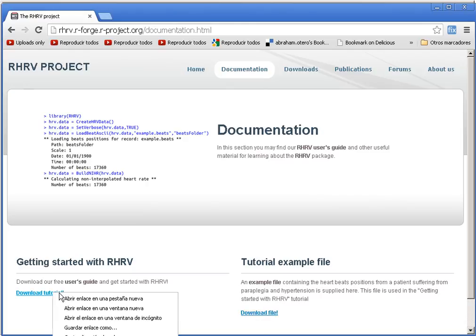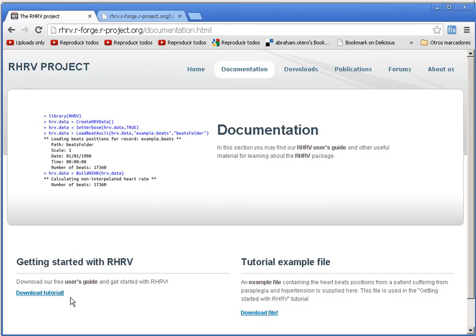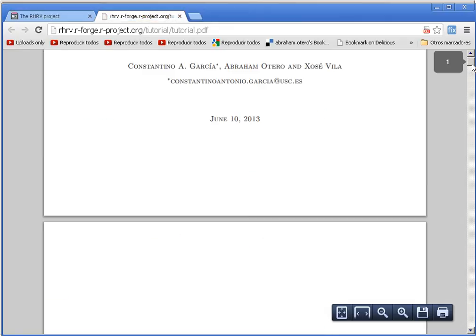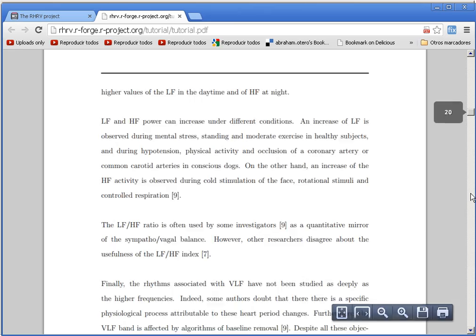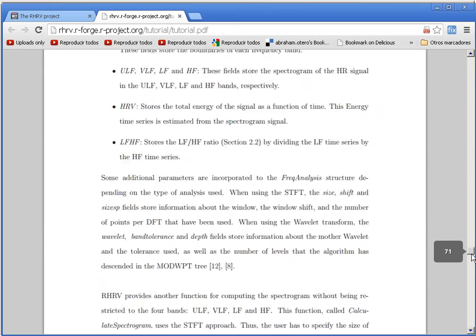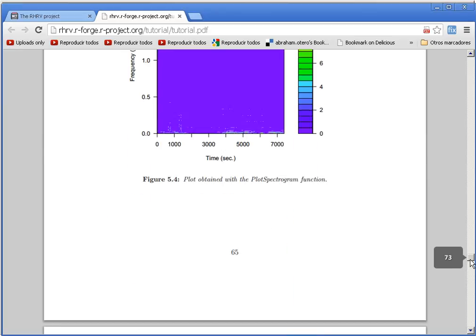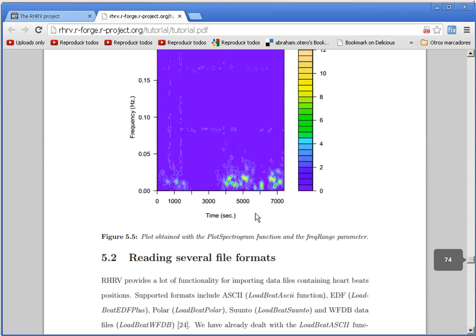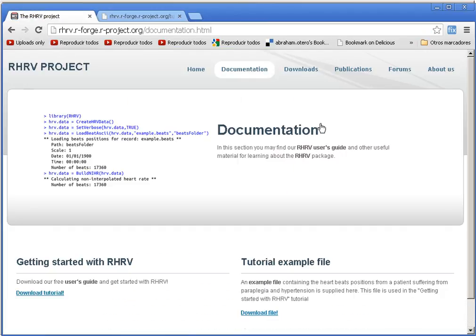It has a lot of information and covers more advanced functionality than the one we have covered in this tutorial, so I recommend you check it if you are interested in knowing more about the tool. You also have forums where you can ask questions, submit patches, bugs, etc. We have a list of publications where we explain how we have implemented the functionality of the library.